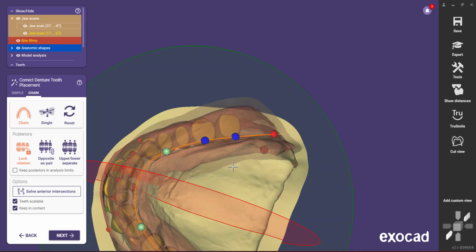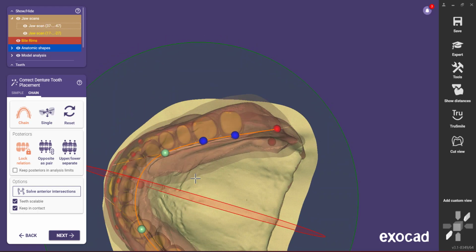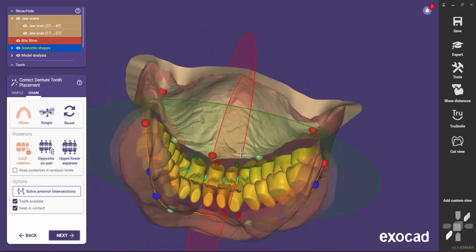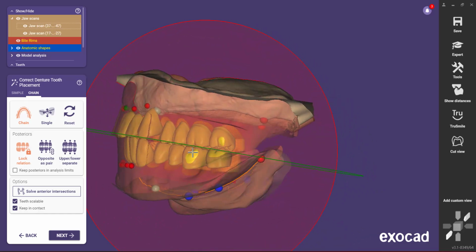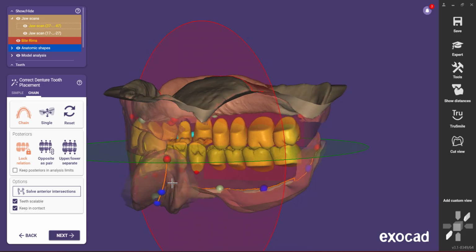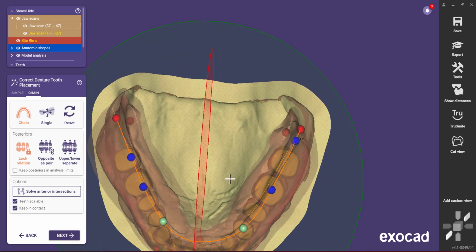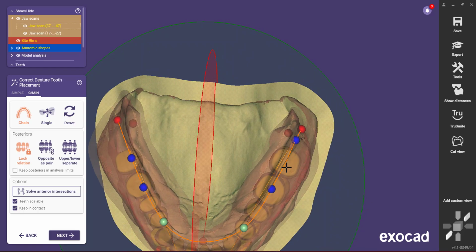Now bear in mind, you've got drawn on here the top of the ridge. So do I want to be that far off the ridge? I probably don't. In an ideal world, I'd have my mandibular buccal cusps, which are the functional cusps, centered over the top of that for maximum stability. I'm going to compromise that just a little bit.